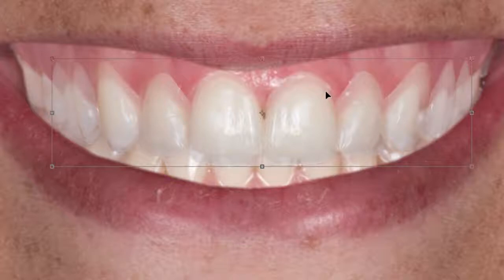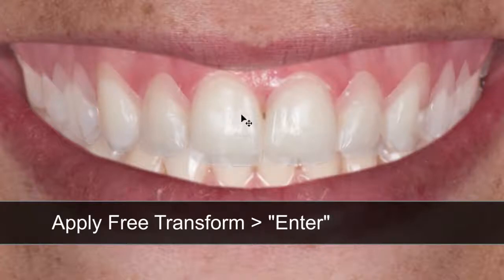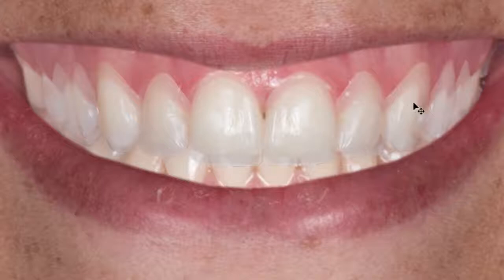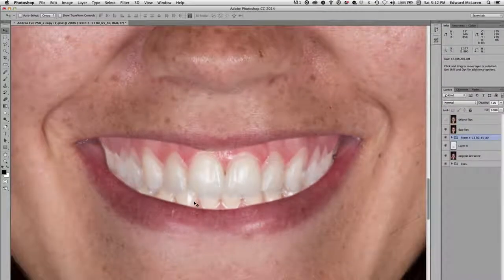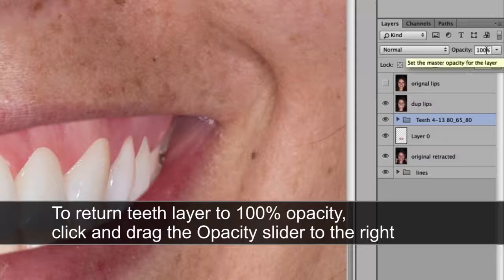Okay, great. Now once I've got it pretty much the way I want, I'm going to apply that by pushing on the Enter key. So there's the Enter key that just applied it. All right, now you can see I've got some little things that maybe we don't want. Maybe we want to do a little more crown lengthening up here. Maybe we want to just change the teeth individually. All right, now I can go back to 100% opaque at this point.